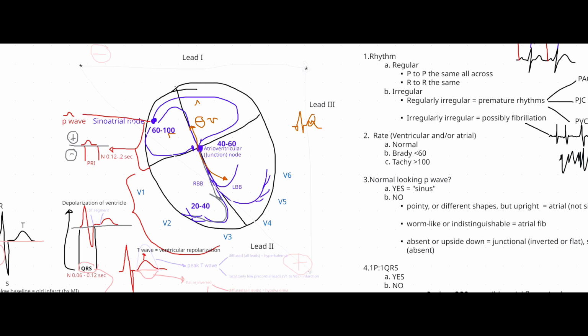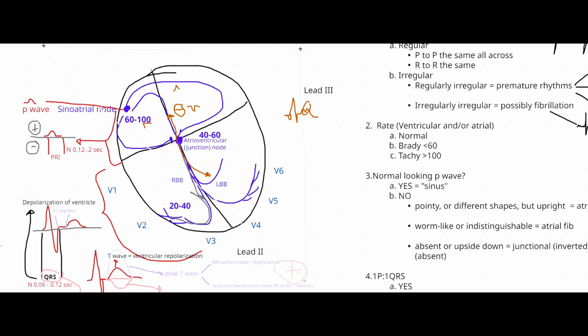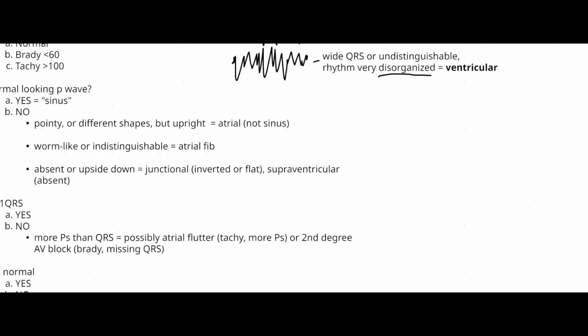Let me show you how it might look. So an SVT, what you might notice is, wait, is that a P or a T? Well, P is smaller, right? No, don't use sawtooth. I will show you what sawtooth looks like in a minute. The P disappears before the T because the T is bigger, right? So in a rhythm like this, because it's so fast, you're not seeing the P, but you're seeing the T. So these are T's.